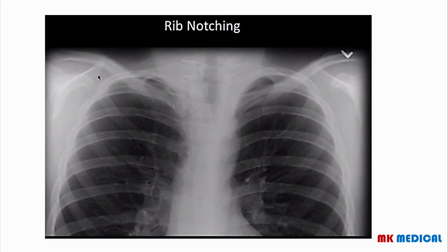So here is rib notching. I don't know if you can see this from the x-ray, but how you should be able to notice is you should follow the outline of each rib individually. Follow the upper outline, then do that on the other side, follow the lower outline, do that on the other side, and you'll see that there are some bumps on this rib like that.